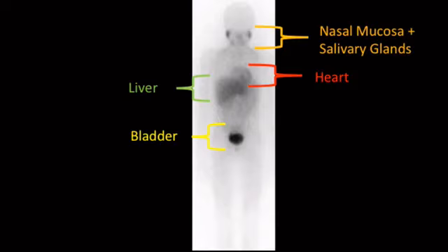So bottom line is, if you see faint, morphologically normal uptake, i.e. it looks like an adrenal gland, V-shaped or Y-shaped, on SPECT, less than liver, without a corresponding mass lesion, it's normal. But I don't expect that they would do that on the exam, because that would be major trickery, but that's a practical real life thing.